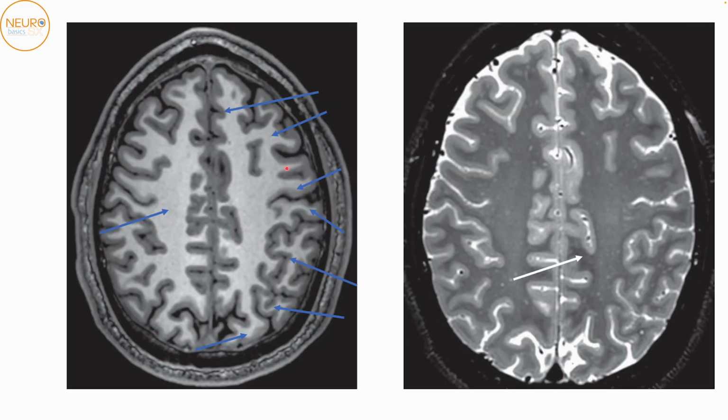Okay, so in the next cut, we can stick with some of the things we've discussed in the previous cut. This will be the superior frontal gyrus. The next gyrus will be the middle frontal gyrus, and the next gyrus to that. Here, we have not yet reached the inferior frontal gyrus. So this can be slightly confusing.